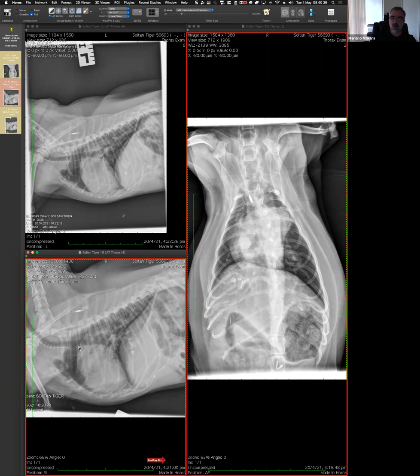And then I don't know how to make you think about what this is. And actually, I didn't think about it until someone told me. So maybe I tell you, because we are almost like 40 minutes in. So this dog, I didn't know when I looked at the images. But then when I tried to find the clinician and said, this looks like severe pulmonary hypertension, there was this, yes, this dog has a PDA. Wow.